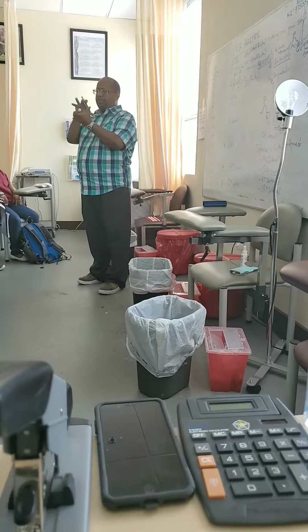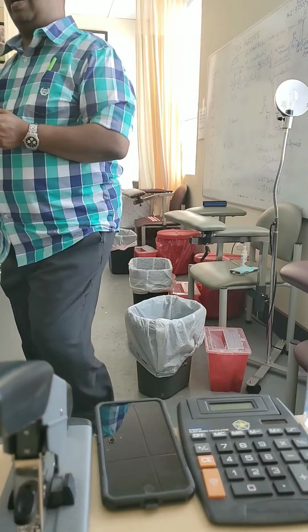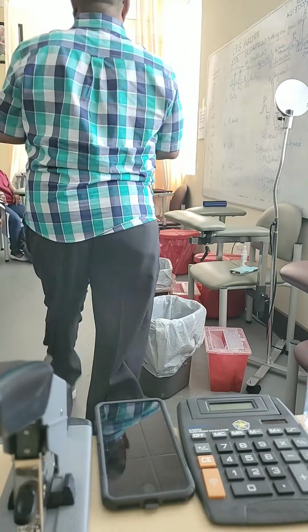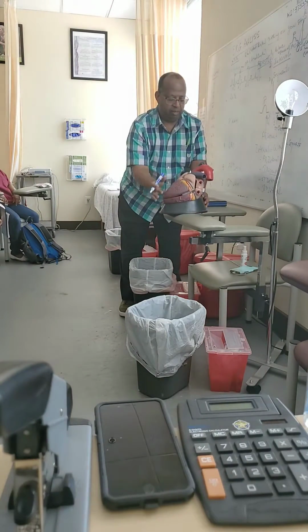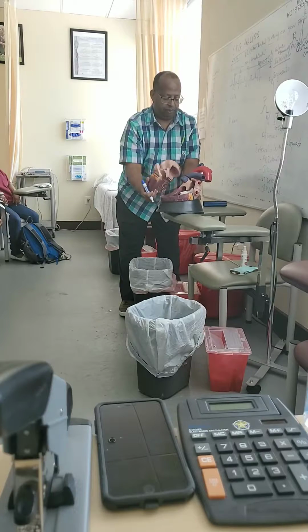If you see the heart, we have these two things.